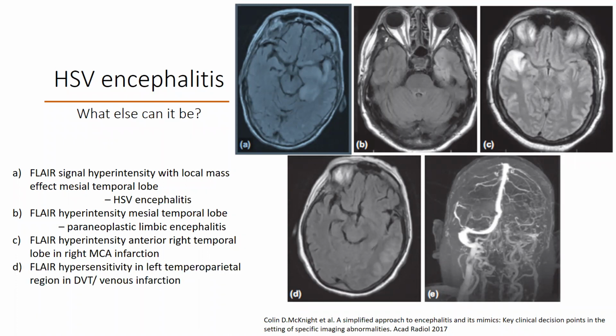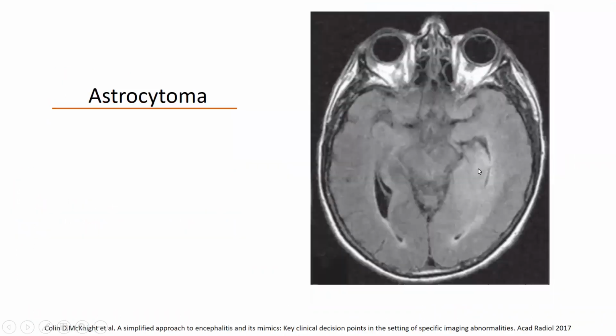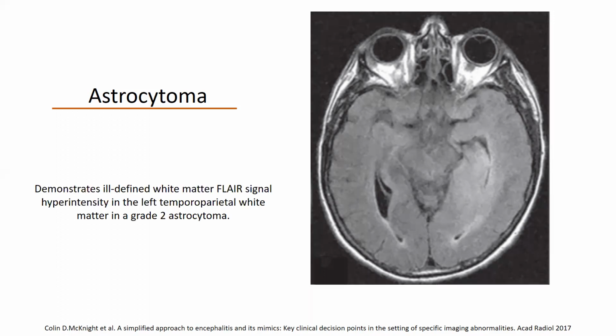Correct. So, like we discussed in the earlier class, where there is a typical arterial territory, here there is a patient with a left transverse venous sinus thrombosis, and again the venous territory will be respected. So this is another patient who is a case of astrocytoma. Here you can see there is involvement of both medial and lateral temporal lobe. The gyri are swollen up. There is a FLAIR hyperintensity. So this is a patient with an astrocytoma, which can again mimic a patient with herpes encephalitis.